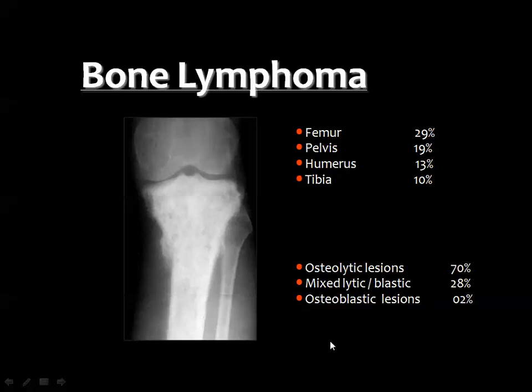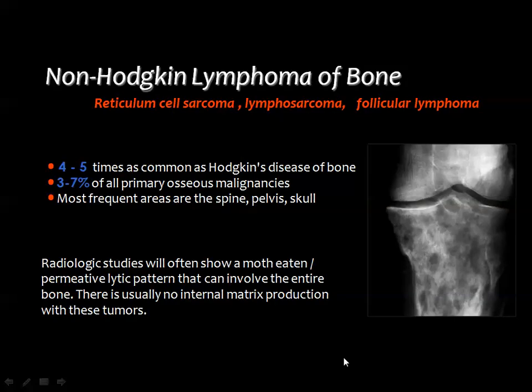Also, this is stated in the literature, but in clinical practice, we usually diagnose lymphoma based on the presence of mixed osteolysis and bone sclerosis. And you can see here in the proximal part of the tibia, there is heterogeneous appearance of the bone texture with areas of sclerosis alternating with other areas of osteolysis.